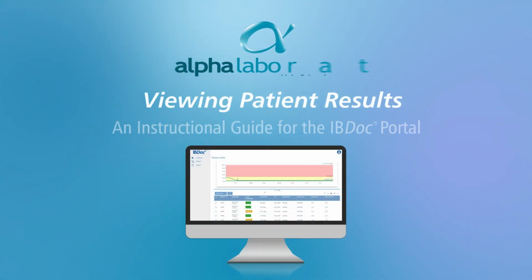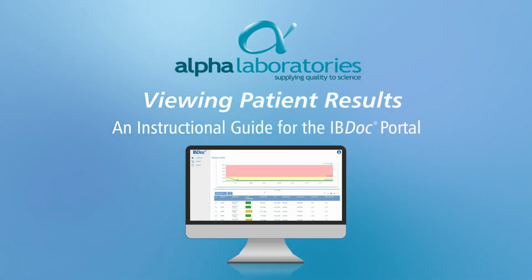Welcome! This video is an instructional guide for the IBDoc portal. In this video, we guide you through viewing a patient result.